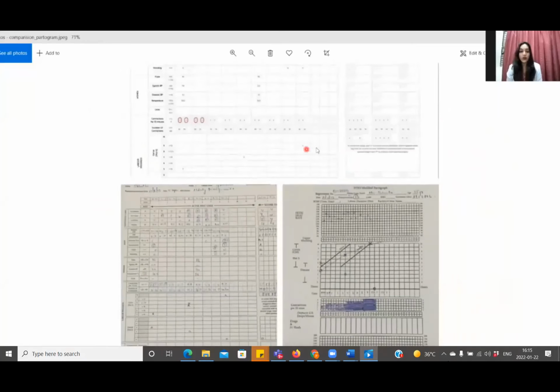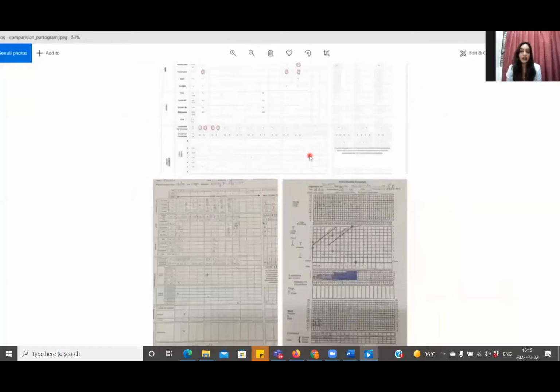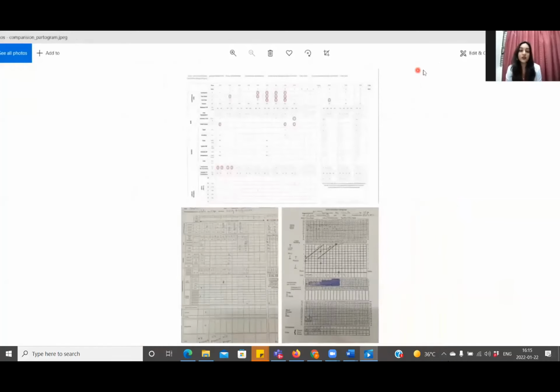The advantage of the digitalized partogram is the color-coding of alerts. Basically, the alerts have been encircled and color coded. And the second thing is that this is all real time. We cannot be retrospectively plotting it, which is very important. And the third part is we can take a printout at the end of the session and lessen the burden of documentation.